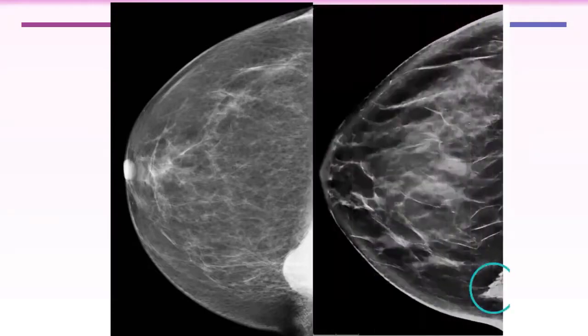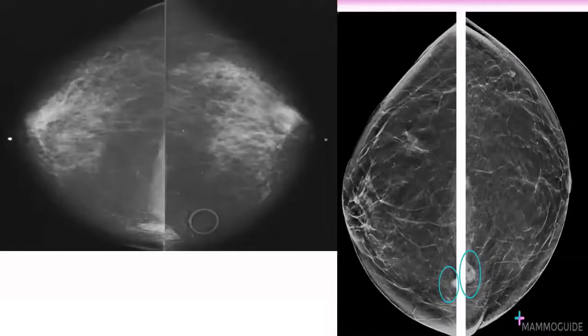Okay, and what about this? This is more typical of sternalis muscle because of the flame-shaped appearance. And these are two examples of sternalis muscle as a variant. When it is seen bilaterally, it is easier, but in unilateral appearance, it is sometimes a dilemma.